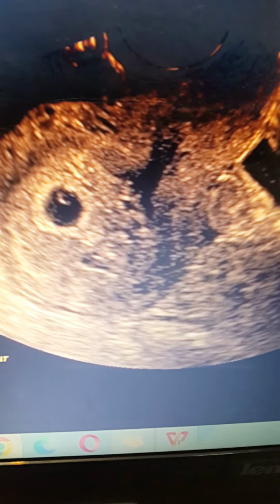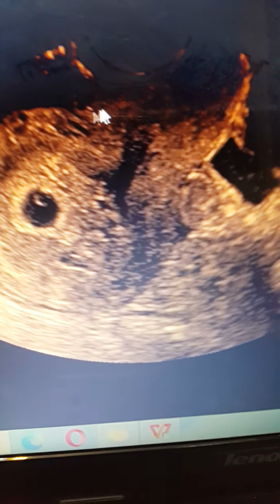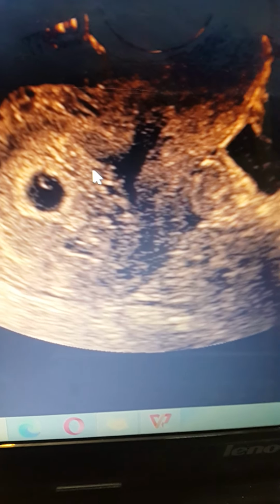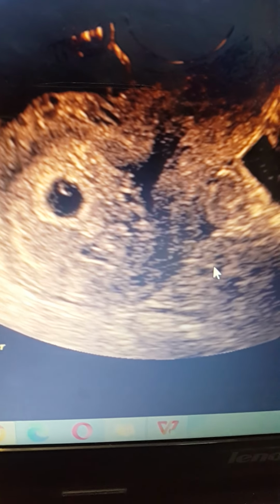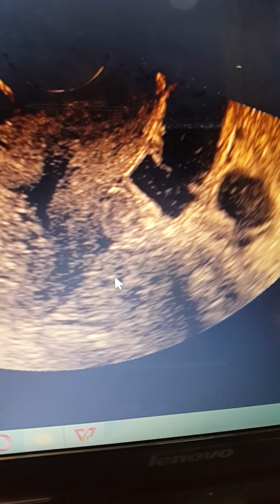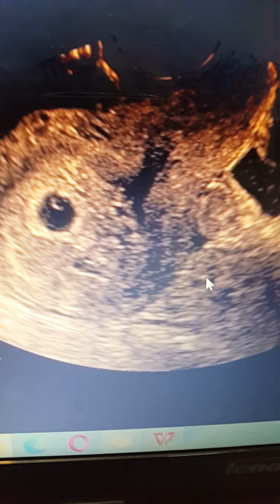And concerning this picture, when I published this case, I mentioned that this is, of course, a gestational sac, but what I mentioned in the quiz is that this is a case of secondary amenorrhea for 5 weeks, and we have a BHCG test positive. So these are the data I have given to you. Of course, thank you all for your comments.